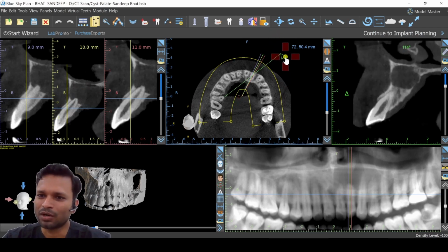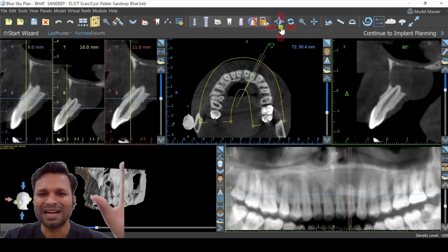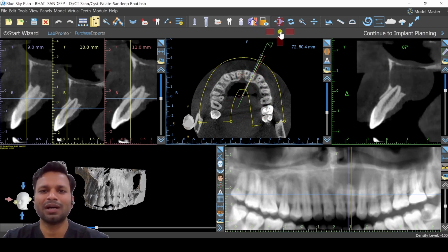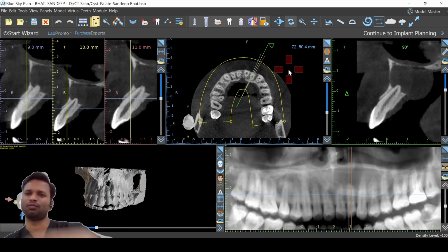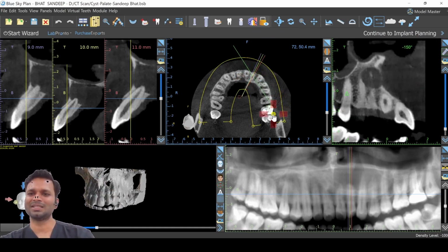What I can do is rotate it and visualize a 360-degree view of that area, that point. Okay, ये जो center में जो area रहेगा उसके around we can rotate and see what the 360-degree view is. Now this is especially helpful in implants. After placing the implant, you want to see whether there is sufficient bone around the implant. What you can do is focus this over an implant and then just rotate it and see the 360-degree view in this.